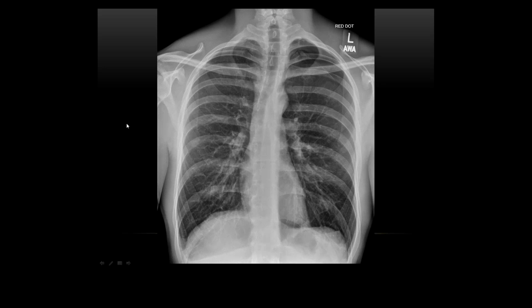That's scoliosis? I wouldn't call it scoliosis. They've probably got a mild curvature of the spine. To classify as scoliosis, it has to have a Cobb angle that's over a certain degree. So with that, you might have said minor curvature. Someone's put left apical pneumonia. Apical pneumonia? Really?